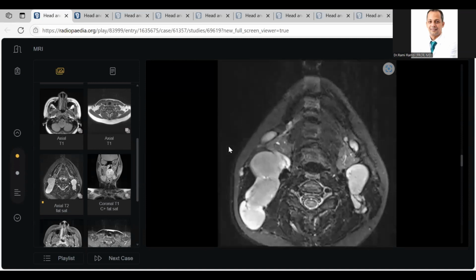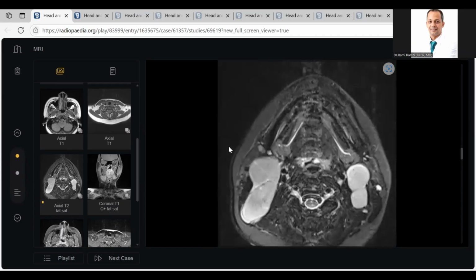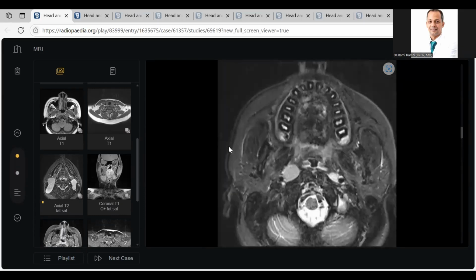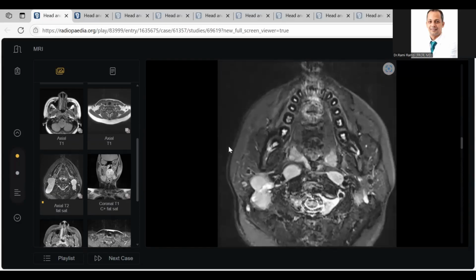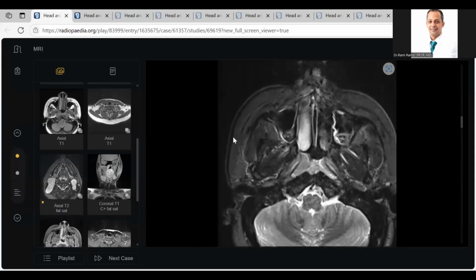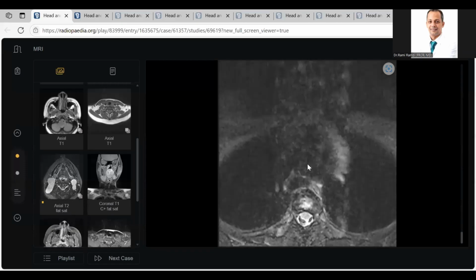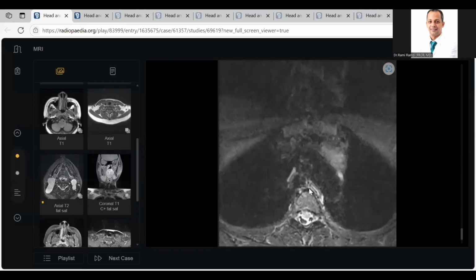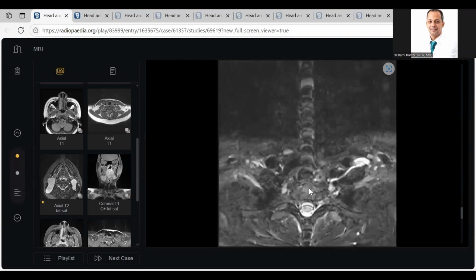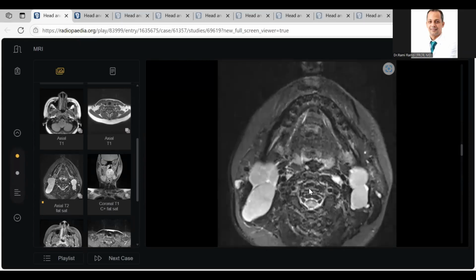Second point, take home message for all of you, my colleagues. With any cervical lymph nodes, be sure that there is something hiding behind it, either from the nasopharynx, like here, this is asymmetrical soft tissue thickening of the nasopharynx, nasopharyngeal carcinoma until proven otherwise, or from the lung, anything, cancer, TB, infection, whatever. Cervical lymph node is like a comparse in cinema.